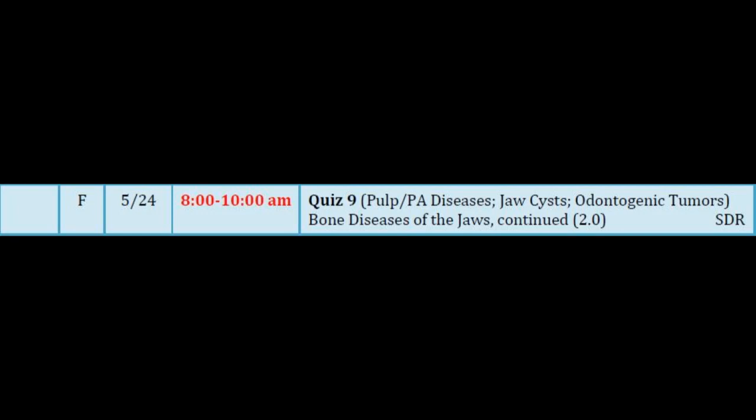This one, do you think you see abnormal changes? Do you see the widened PDL? Yeah, that goes around. Notice how the density of the alveolar bone progressively gets more dense as we go anterior to posterior. So up here it's fairly normal, and then here it's getting more dense and a little clumpy, and then we get a little spiking on the alveolar crest. That is not normal. We should have a distinct edge to the cortex, and here we get some opaque spiking, and here very distinct opaque spiking.